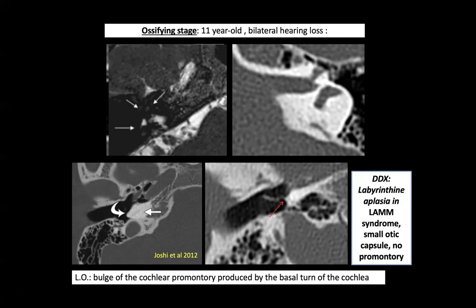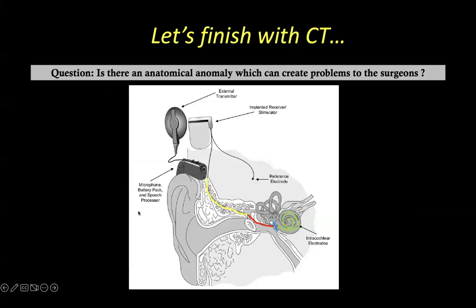But remember these differences. Of course, the clinical context will be also different because this child was not born deaf, but developed deafness after labyrinthine ossification. Let's finish with CT.